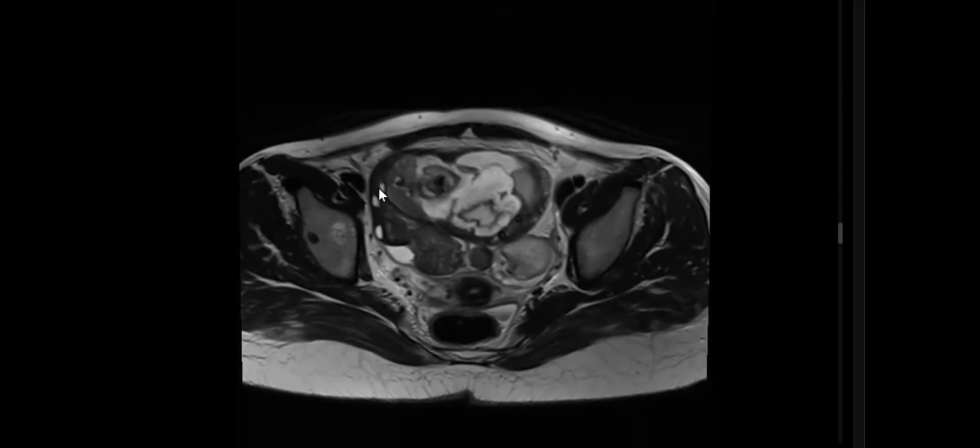We have a very good sign here. Compare the ovarian stroma in both ovaries. What about the stroma around the follicles? High or low signal? Very low signal. What about the normal left ovary? It is showing intermediate to high signal. Very good. So what do you expect happened in the right ovary?